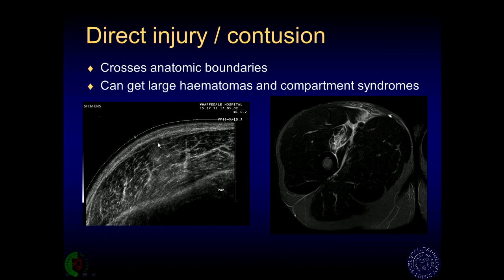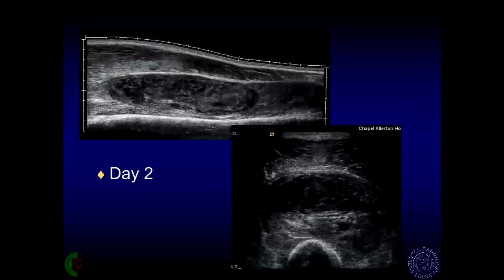So you can see the muscle's a little bit thicker than it would normally be. This capsule is lifted up. And you see the same sort of appearance here in the sartorius. Very typical for direct contusion. Hematomas are not unusual in these cases. They're closed injuries quite often.